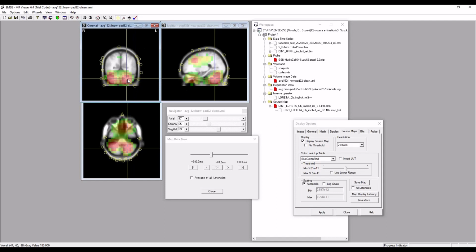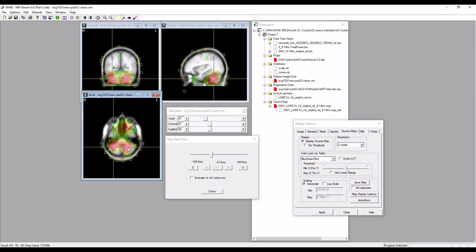Indeed, this is coming into cerebellum on the left side, but also we see some on the right side at this latency. And it's separated out, so this looks plausible because we have two hemispheres of the cerebellum, and we're seeing something in both. So that looks promising.